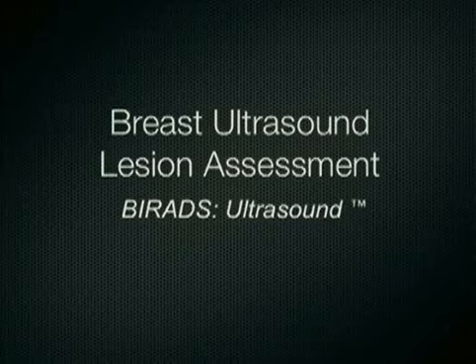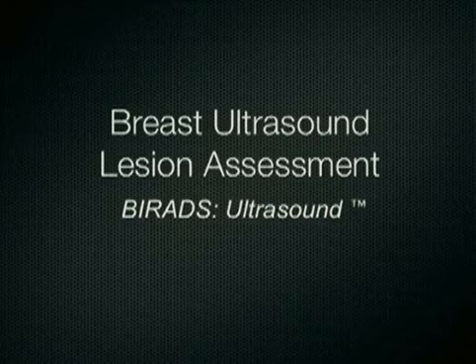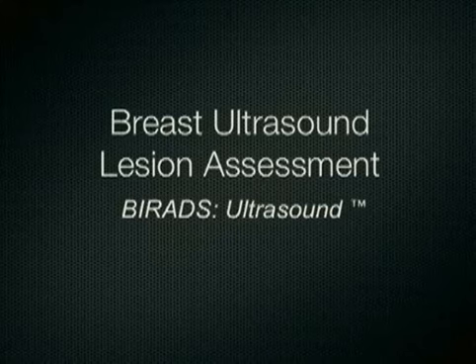For a number of years, the ACR BIRADS lexicon has been used to assist mammographers in describing the mammographic features of breast lesions. Recently, a lexicon for the description of breast ultrasound features has been created by the American College of Radiology, BIRADS Ultrasound. This is an important addition in view of the growing use of ultrasound as a complement to mammography in the evaluation of breast lesions.